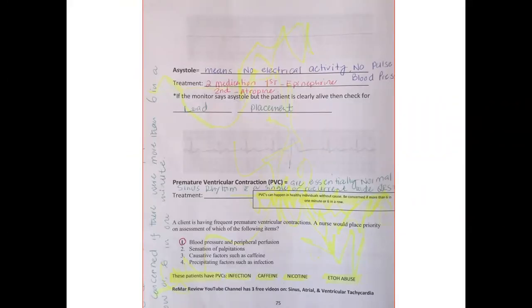And now let me show another one. In this second picture, you can see the normal events: P, QRS complex and T-wave. This is normal, this is normal, this one is normal, but unfortunately something is abnormal in between the normal ones, right?